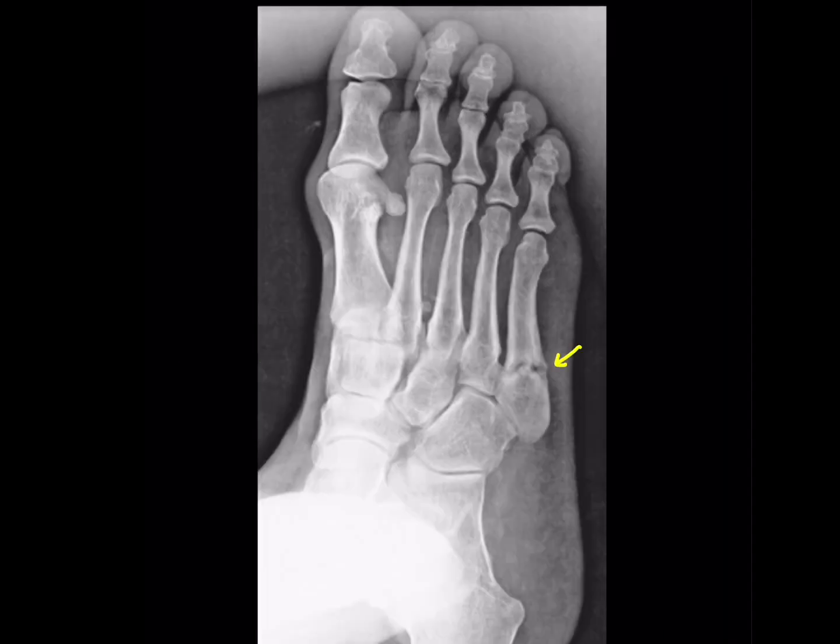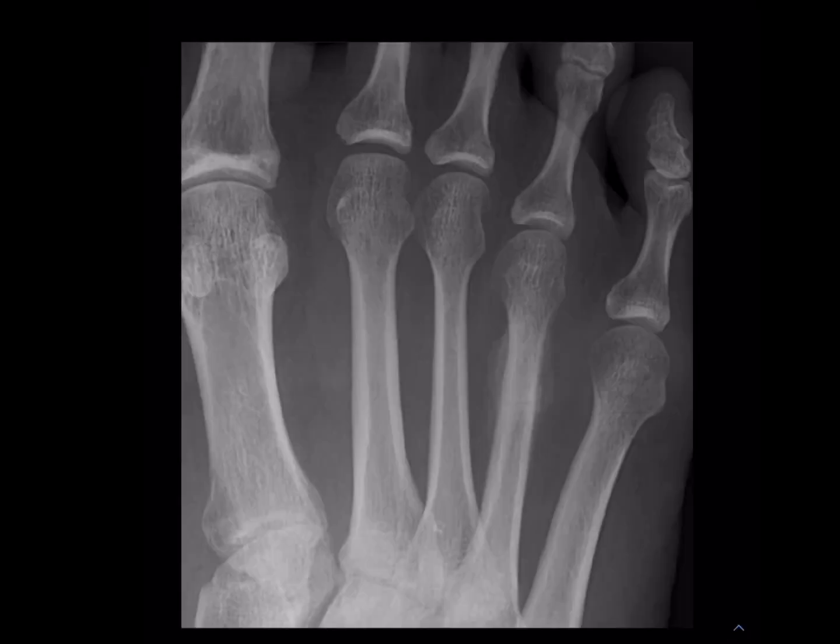This is a transverse fracture that lies distal to the articulation between the bases of the fourth and fifth metatarsals. This is not an avulsion injury, and it occurs as an acute injury or following repeated stress affecting this metatarsal. And next is the stress fracture, and this is most frequently missed. In this radiograph, we can see that at the fourth metatarsal bone, there is a subtle radiolucent transverse line here, and also associated periosteal reaction.